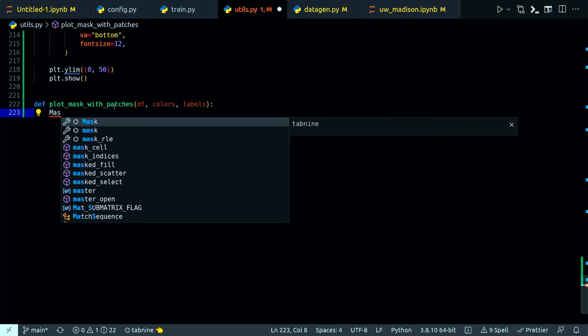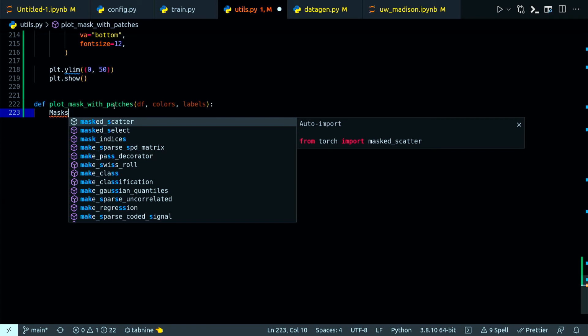So here, first I need to generate a random set of indexes that will contain some values for the large bowel, and similarly I also need to include all the indexes which will contain some values for small bowel and the stomach. That is, I cannot have empty indexes here, because I am building this function to build the plots of the mask, so I definitely need some images where some of the mask has been identified for the three segmentation classes.